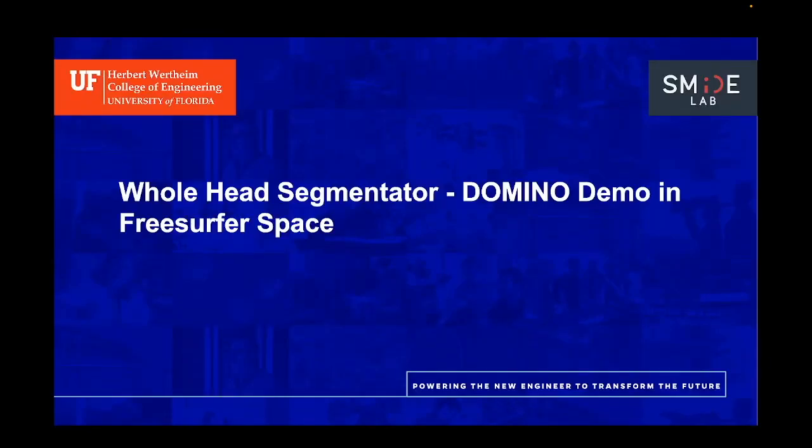Welcome back to the whole head MRI Segmentator from Smile Lab. In this demo, we'll run Domino in FreeSurfer space and review the results.